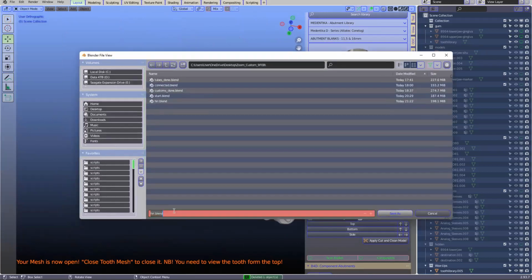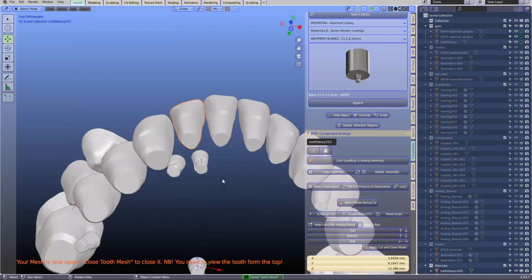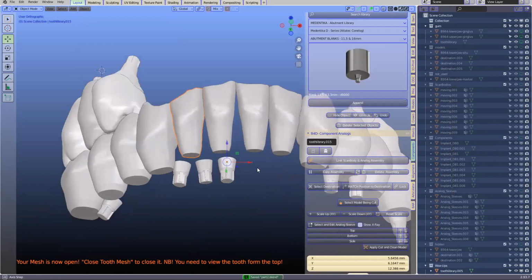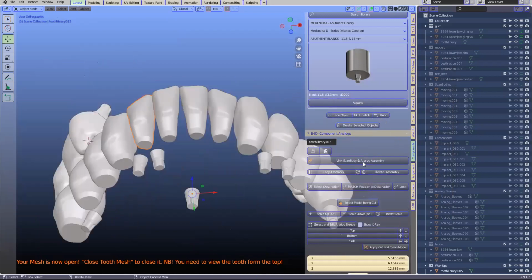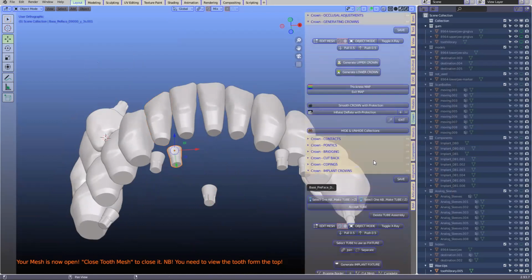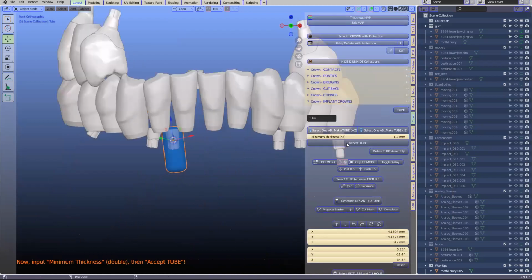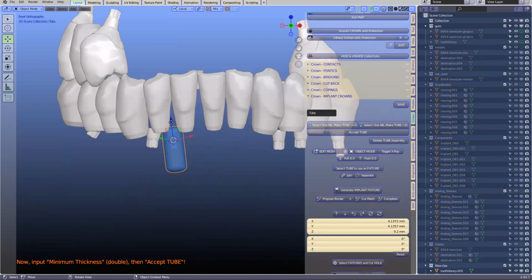Because what I think is very interesting is the front lower ones. They're very close for one, and also you've got to stretch the mesh a hell of a long way, or you've got to rearrange the teeth a bit. I'm not sure what's the best. No, well, I've actually done this today, and it worked very, very well. Okay. So if we've got enough time, we can just see how this pans out. I'm really interested to see you work on that tricky one. Yeah, those two teeth, because that's a real challenge.